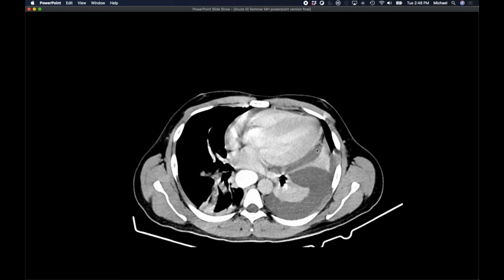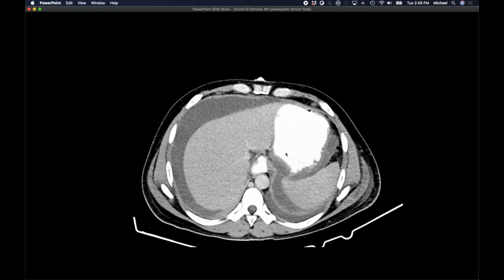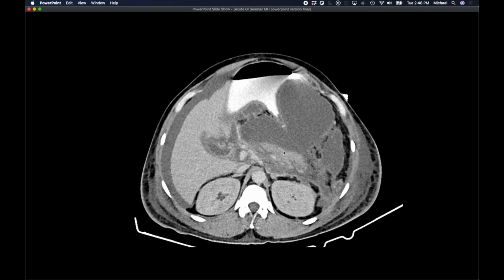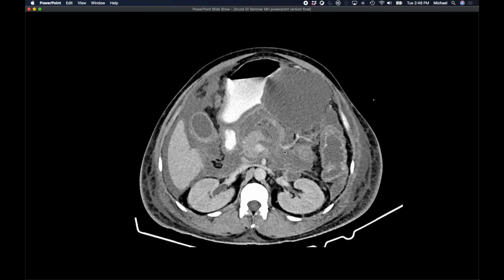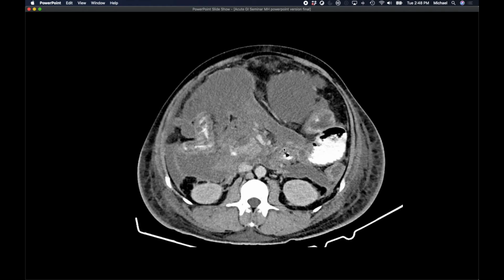You'll start with a blank slide, and then after your first click, the first image will appear. And now I'm using my middle scroll wheel to scroll through the images. And it has a pretty smooth, almost PACS-like feel to it. So I can scroll down, I can scroll back up. There's a little bit of a lag, so maybe I have a few too many images. But overall, a pretty smooth scrolling experience.